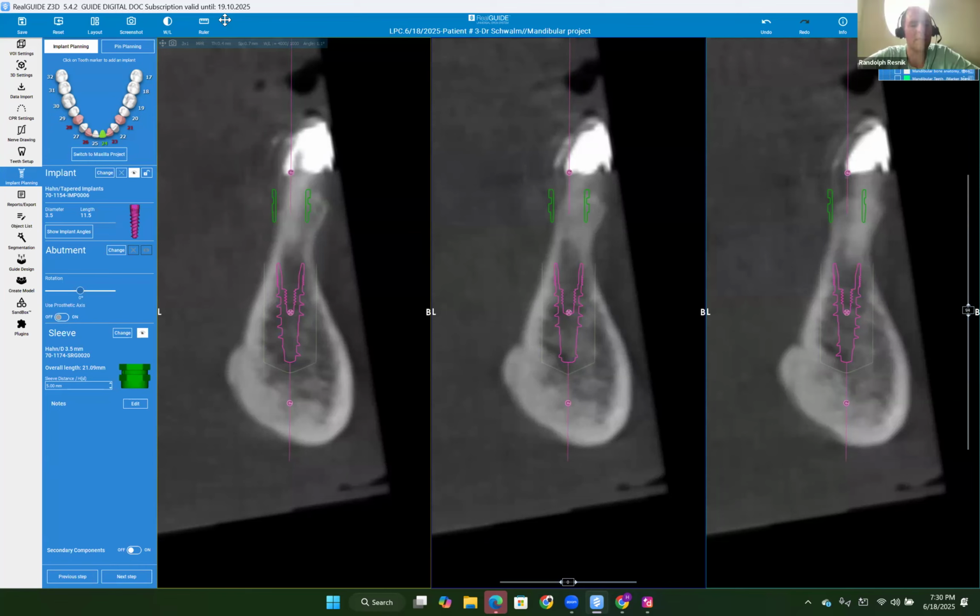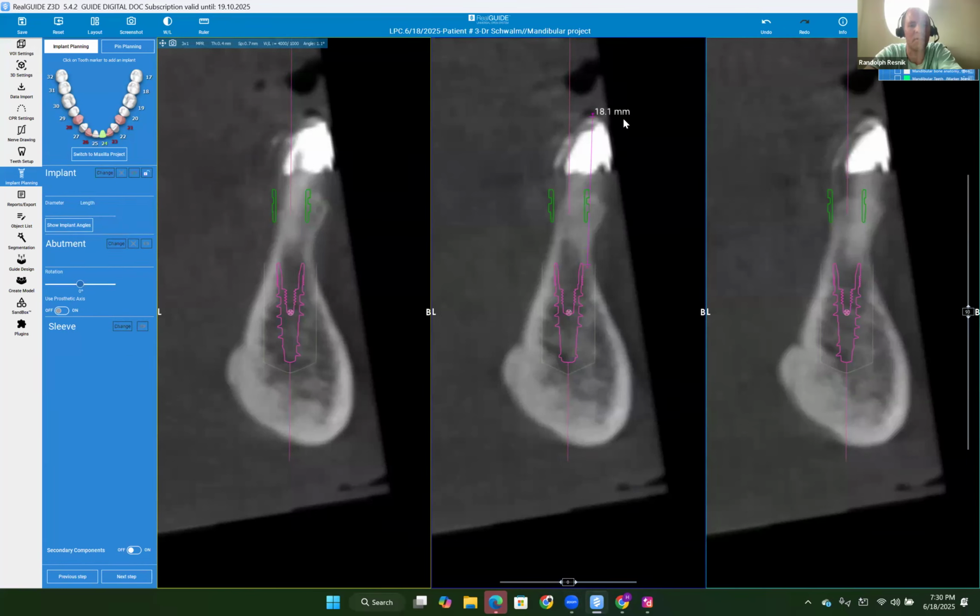Hussein, can you just measure from the platform of the implant to the incisal edge there? Absolutely, sir. Here is just the restorative space. You have more than enough there. So you have 18, which gives you some leeway if you do need to shorten the incisal edge position. Now, a lot of times what you'll see, and I think there's a case a little later here, is when somebody has an upper denture and they only have their lower anterior, you'll get super eruption there.